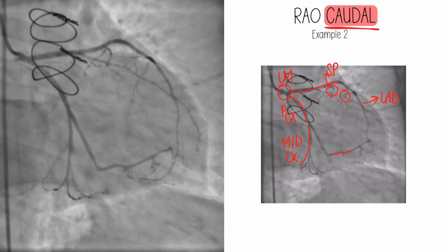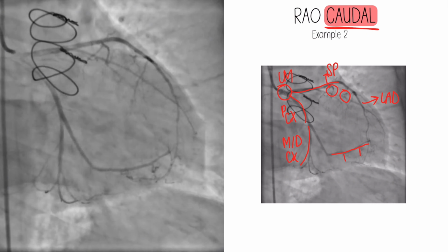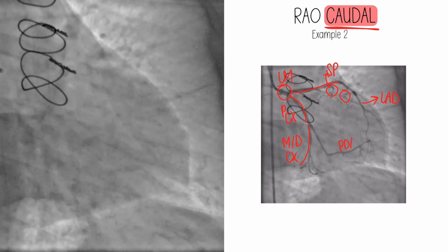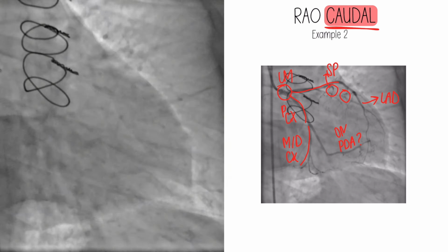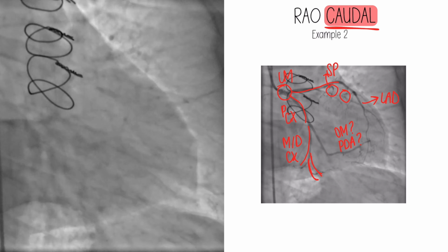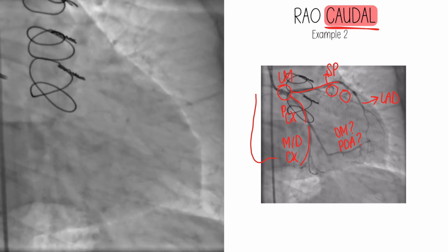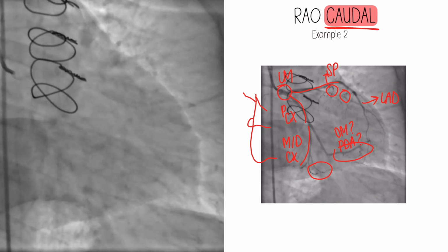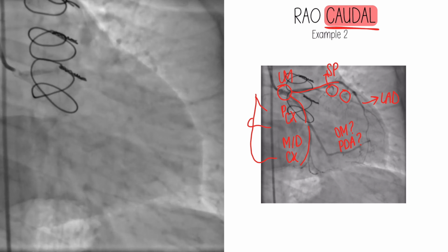Then you do see this cut across here. I do see either septals or collaterals. It could be collateralizing something because this LAD, if it is LAD, is very, very small. So we could call this maybe the PDA, maybe an OM. And then these could be, again, we would need to see the other side, PL or OMs. But let's say the RCA is here and non-dominant. Okay, the RCA is here, very, very small. Then you could be comfortable calling this a PDA or a PL. But the patient does have small vessel disease, so that is very difficult to see.